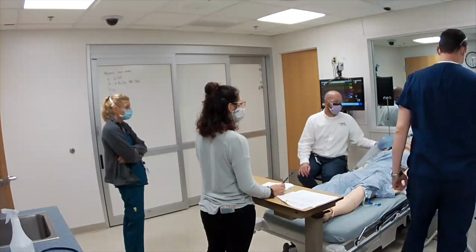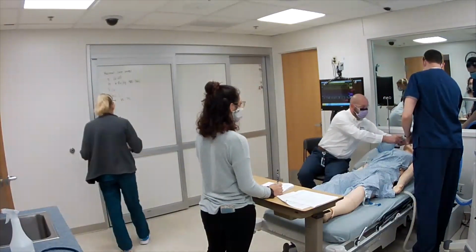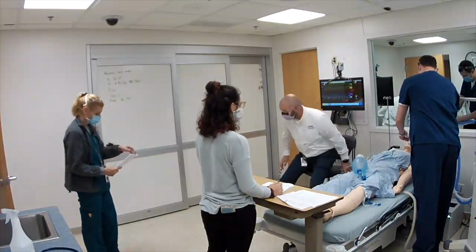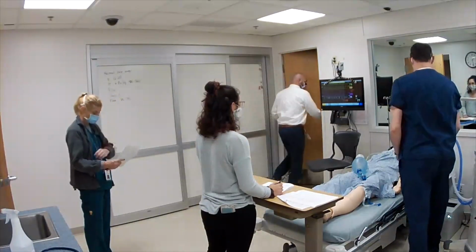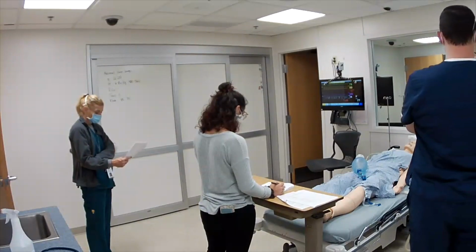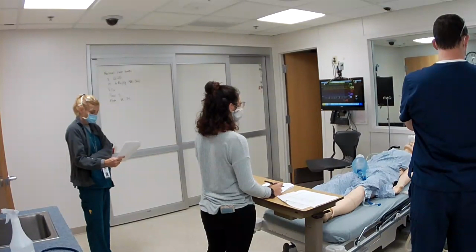Alright, Paige, did we get all of that in our handout there? So far for the ventilating settings, yes. So now that we have our baseline vent settings, let's look through the parameters and then discuss it. Okay. So we're gonna walk right through all those numbers on the vent there. So Shannon, we start there at the top.